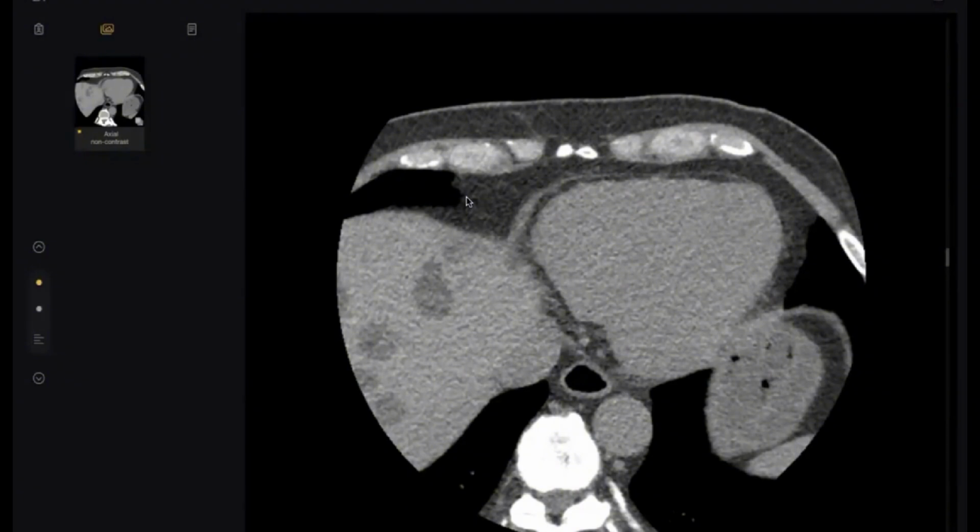I was about to ask why you are requesting MRI. Doctor, do you need MRI with contrast or without? With contrast mainly for metastasis, if I'm suspecting metastasis, to see the enhancement of the lesions, the pattern of enhancement. Great. One second, I will show you the MRI.